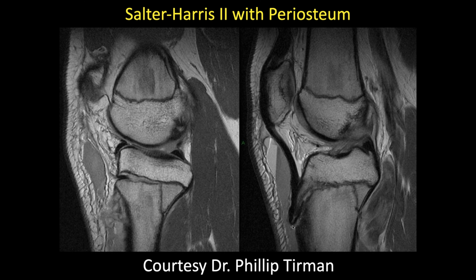The tibia, you can take out the bone and put in fat and open the physis up, but the tubercle, that's a different ball of wax. So I would leave this alone. There's been enough trauma already due to the injury. Just think that this tibia was open at the physis and then came back together and pinched the periosteum. That must have been open as wide as that periosteum is long.